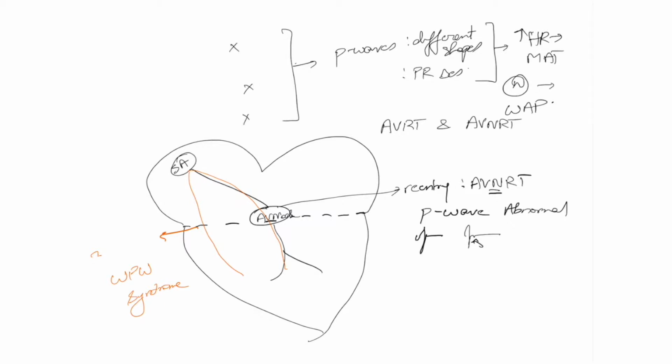So you see a P wave followed by a short PR interval, and then because the conduction system isn't as efficient, you would see a slow slurred upgoing wave. So this wave is called the delta wave. And eventually, the impulse does go through the AV node and follows the normal conduction system. And so, normal conduction system resumes, and the QRS complex looks okay from that point on.